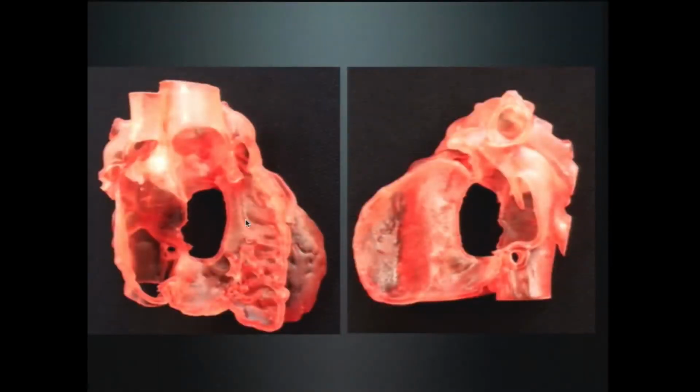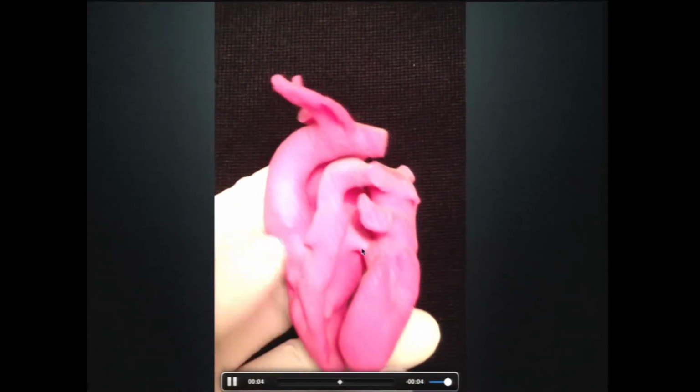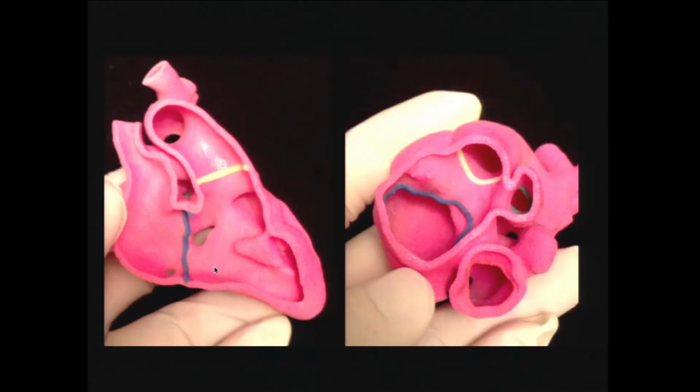So this is a classic atrioventricular septal defect, which is quite far away from the aortic and pulmonary valve. However, the infundibular septum is here. Certainly this remote VSD is closer to the aortic valve and possibly baffleable to the aorta. Okay? So this is another DORV with a rather restrictive VSD. And then inside of the heart, this is the right atrium, right ventricle. This is the aorta. This is an infundibular septum. Below there, you have the pulmonary outflow tract. The VSD is perimembranous, rather small, quite far away from the aortic valve.